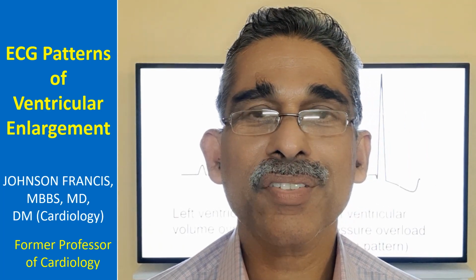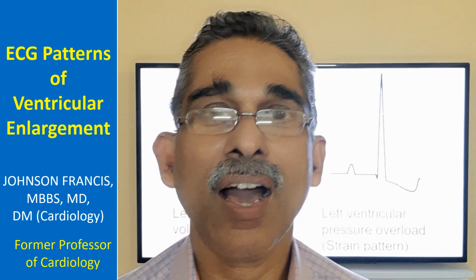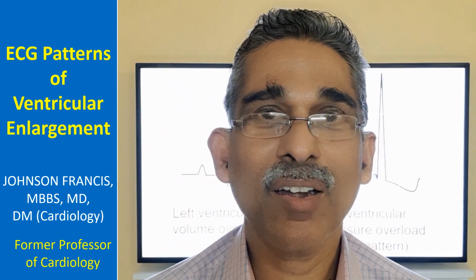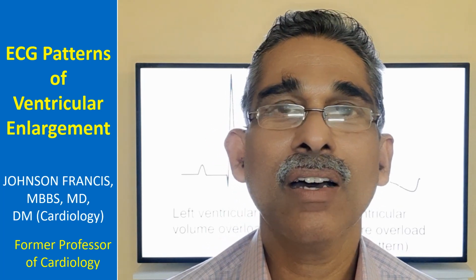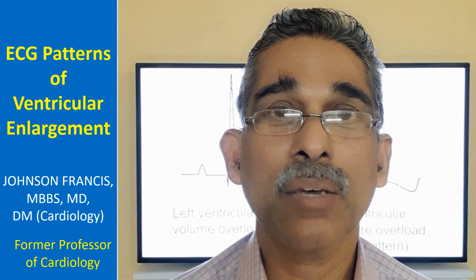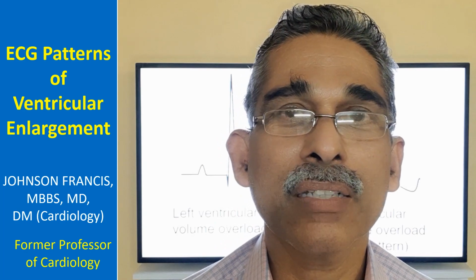Now we are going to discuss ECG patterns in ventricular hypertrophy or overload. I'll be concentrating on patterns rather than specific criteria for right ventricular and left ventricular enlargement. There are some named criteria, but this discussion will be on the patterns.